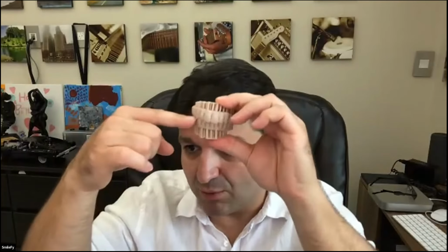When you go to the mesh editor, you have the centric occlusion, but in some cases the lower design was not loaded. That's fixed, and next week, during the week, we're going to have an update with this small fix. If that's the issue, then we are on it. If it's a different issue, then I don't know. Yeah, Asiga, exactly. Asiga and formats.